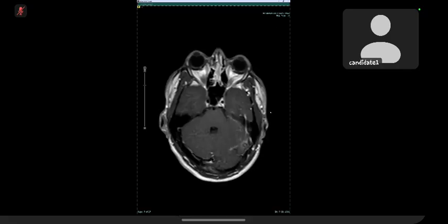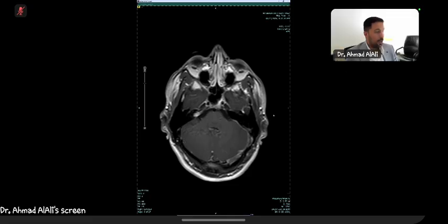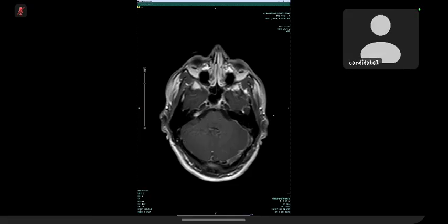These leptomeningeal and pachymeningeal enhancement can be due to some infective pathology, or if the patient is a known case of some primary, then this can be due to leptomeningeal metastasis. These can be due to sarcoidosis as well. In the left transverse sinus, there is some central filling defect. However, there is no mastoiditis, no sinusitis, but it can be due to left transverse sinus thrombosis. If there are any predisposing conditions, like some infection or dehydration, that can lead to transverse sinus thrombosis.